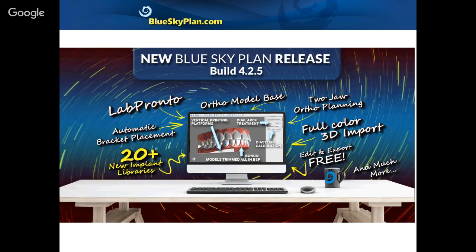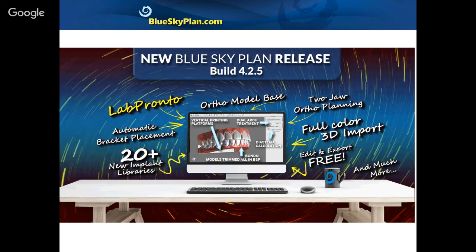So you're definitely encouraged to go download the software if you don't have it yet and get started with your Ortho cases. In addition, continuing with free functionality in the new version of Blue Sky Plan 4.2.5, you're able to do a lot of different editing and model manipulation to different surfaces, such as CT and STL surfaces, such as cutting, adding a base, inverting impressions, converting CT to STLs, and all of that can be done in Blue Sky Plan and be exported at no charge.